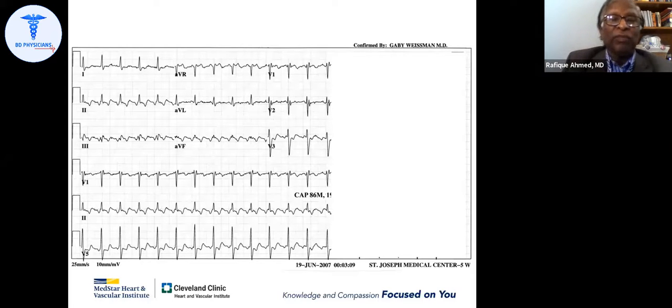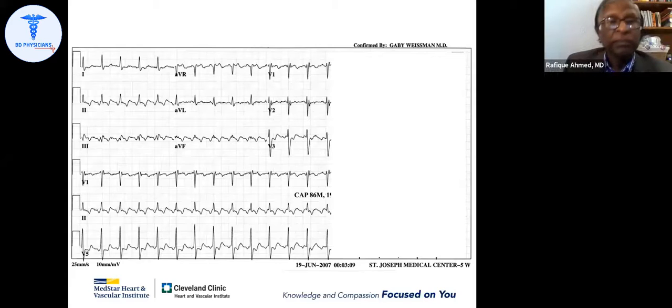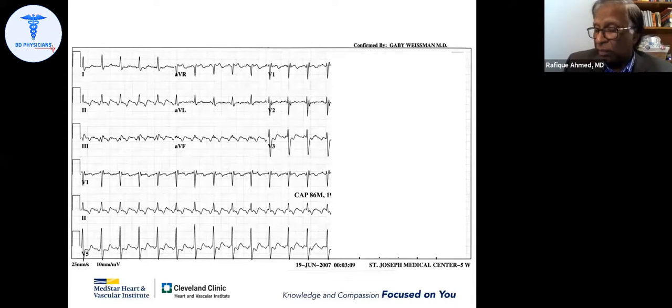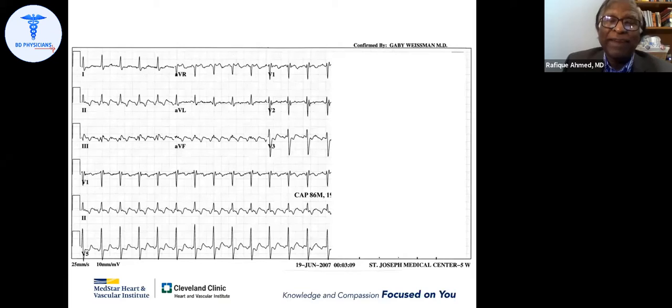So now what is this one? What are the possibilities? Sir, some of the possibilities are atrioventricular nodal reentry, supraventricular tachycardia, atrial tachycardia, others. One more, atrial flutter. Atrial flutter, sir, yes, sir. Yes, and the rate is 125. It can also be sinus tachycardia, right? Right, sir. Okay, now which one do you think it is?